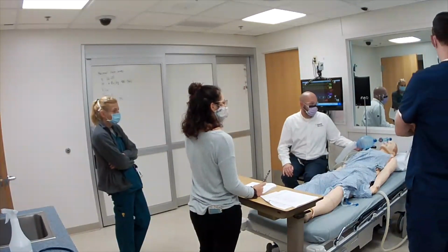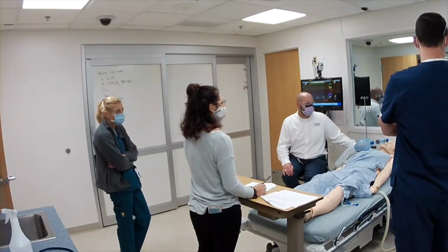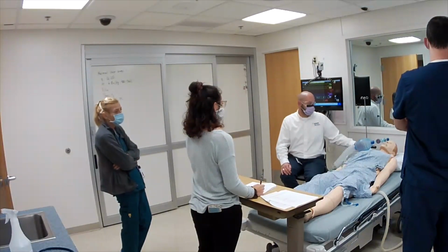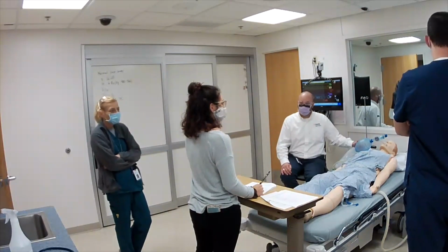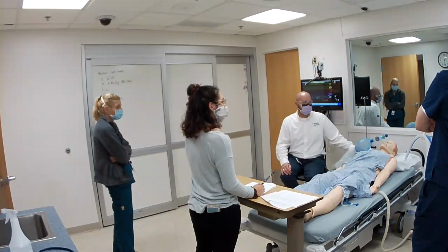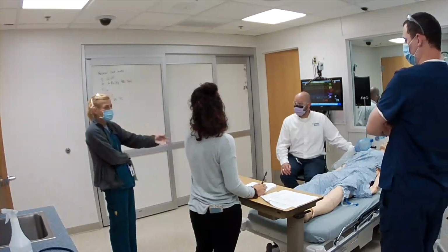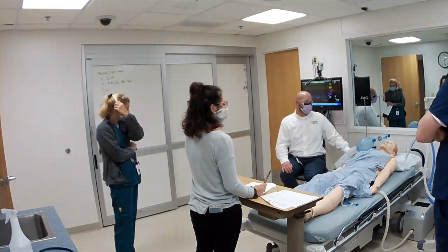Trigger flow is a sensitive subject for me in some ways because I want the patient to be comfortable, but I don't want them to be triggering the vent. I come from a transport environment where bounces and bumps and coughs trigger the vent a lot. So you have to balance the patient's needs with the sensitivity of the vent. We're talking about making the vent more or less sensitive, that's the trigger flow. So for Stanley, it doesn't really matter.